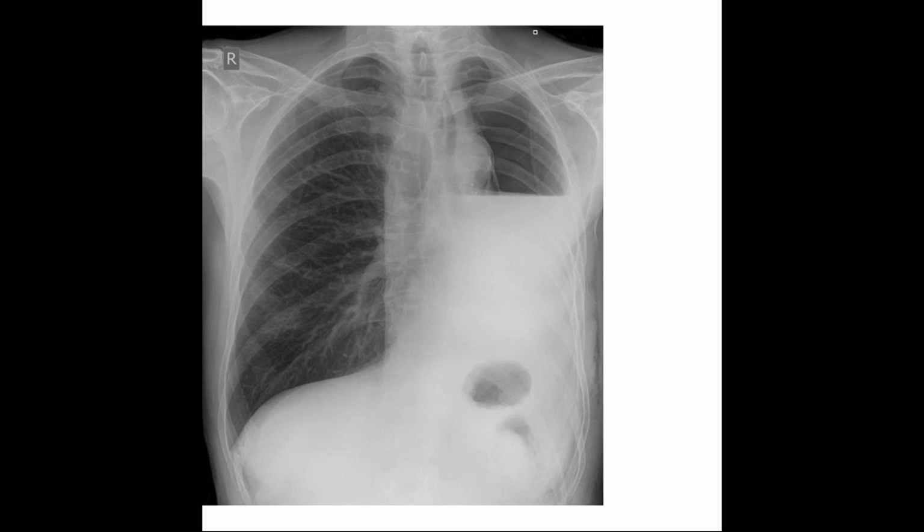Yeah, the diagnosis is fine, but how do you justify that diagnosis? If it is a hydropneumothorax, why is the trachea shifted to the left side? It is definitely a hydropneumothorax. As I was telling you, if you compare the lung fields, collapse of the left lung has happened. There are no markings here. The lung may have collapsed behind this, again not visible. This is entirely a pneumothorax, and beneath it is all fluid. It could be a pyopneumothorax or a hydropneumothorax. Commonly, we say it's a hydropneumothorax with left lung collapse.